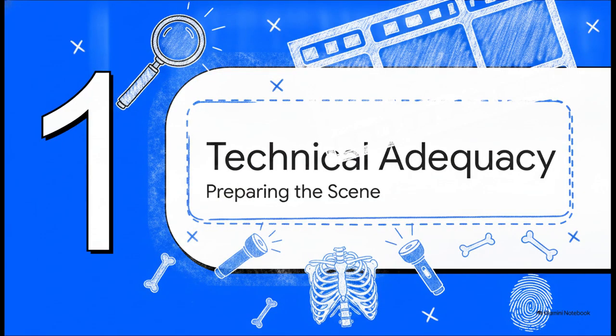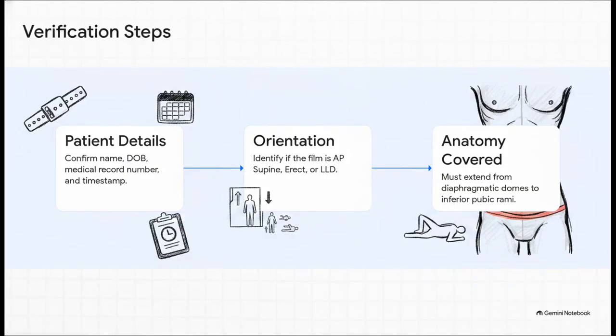X-ray technical adequacy, preparing the crime scene. Before we even think about analyzing any anatomy, we absolutely must systematically verify that the image in front of us is clinically adequate for our investigation. You've got to check the patient details, identify the projection, and ensure the film extends all the way from the diaphragmatic domes down to the inferior pubic rami. Verify the name, the date of birth, the medical record number, and the exact timestamp. Then, make sure the lateral flank soft tissues on both sides are actually included, because let's face it, if you don't have the whole picture, you literally can't solve the case.